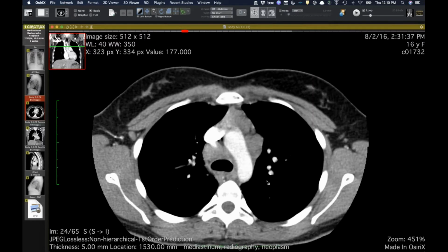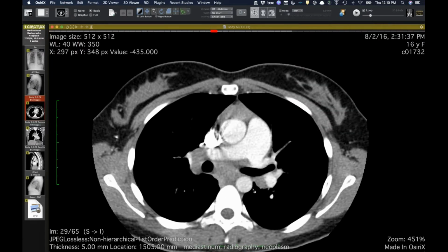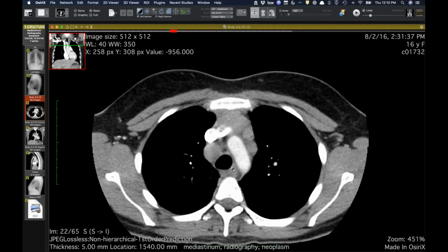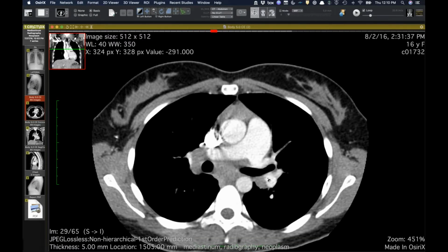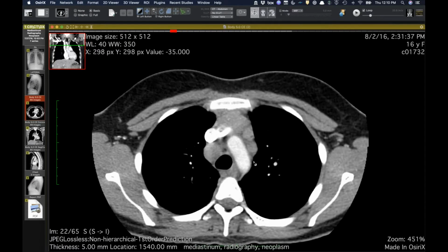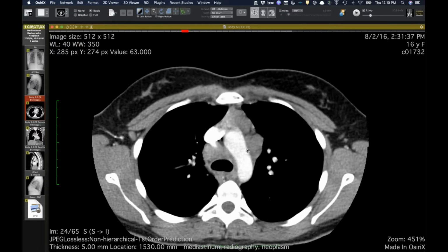They never did, and that was going to be my next question too. Not to throw two diagnoses in there, but looking at this on its own, like you said, especially if they're asymptomatic, you've got the typical distribution with symmetric bilateral hilar, subcarinal, paratracheal, and then you've got some nodularity to the thymus. But I was a little surprised when I saw that.